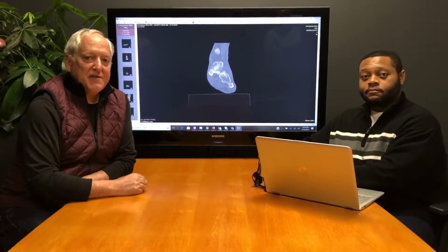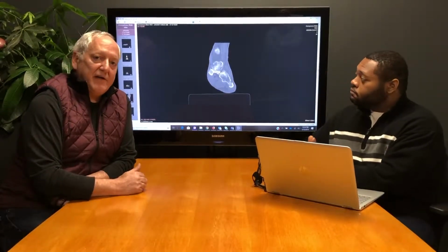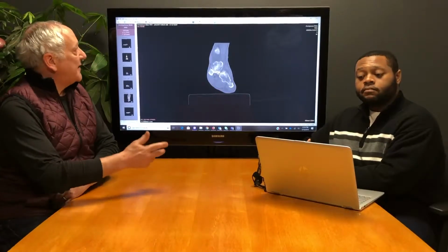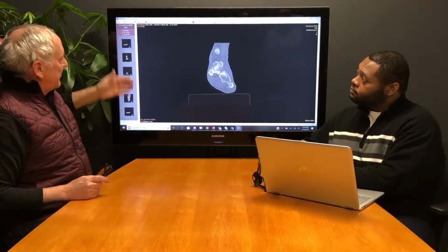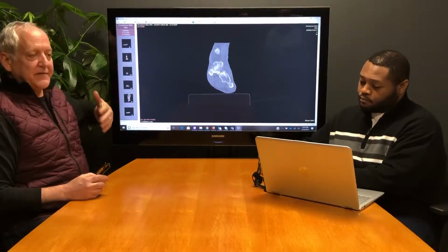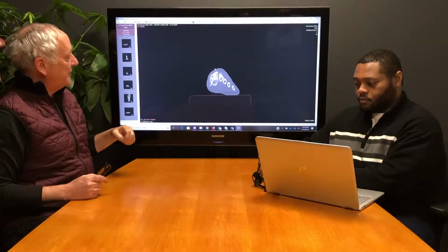I'm here today with Ron Burgess, our lead developer, and Ron's going to walk us through some of our functionality in our gateway. So Ron, I see you've got the program open, and we've got a bunch of series here that we've already loaded up, and we've gotten these off of either a CD or our own PAC server, and they're loaded into our program now.